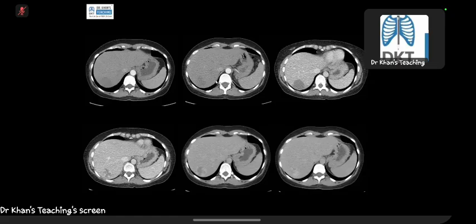If you see the CT scan, there is no enhancement here. Then here, I think you can see these puddles of enhancement. Do you see this? And then on a delayed phase, there is centripetal extension of contrast. Another point to remember is that the enhancement pattern will be equal to what we call the blood pool. What is the blood pool? The contrast in the veins. So it will be equal to that. For example, if you see this enhancement, it will be equal to this, right?